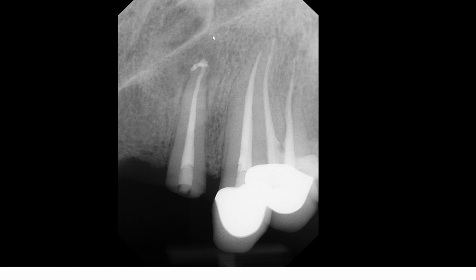Well, you might be asking, well, Dr. Kim, how could we have known that this is a mesiodens? Because although you can see my outline, this area doesn't look anything like a tooth, right? It looks like more of a normal bone. Yes, you can see this area is a little bit more opaque. Also, the fact that this is located above the nasal aperture, what does that mean? Is this sitting within the nasal cavity? Like, how do we make sense out of this radiographic finding?